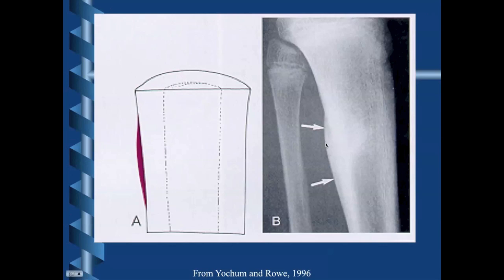If we look at the example over here, this is most likely to be a stress fracture of the proximal tibia, and the stress fracture might be positioned across here somewhere, and we can see this lump of periosteum has lifted up here, and it looks like it's starting to actually calcify now, which would mean that the person would actually have a palpable lump in that particular area.